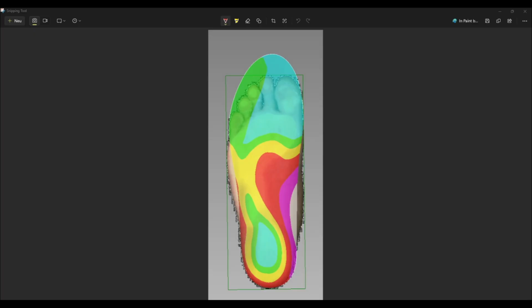So for this, first we think about what we would do manually. Okay, manually we would take some material and glue it like this, probably something like this. Then we would take the scissors and cut away what's overhanging here. This might be the highest area around here, and all the others like here, we would grind down, right? So from here it starts at 0 millimeters all the way here. That's what we would do manually, and exactly that's what we're going to copy in the CAD system.